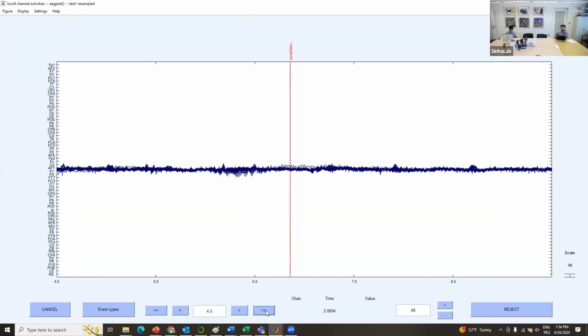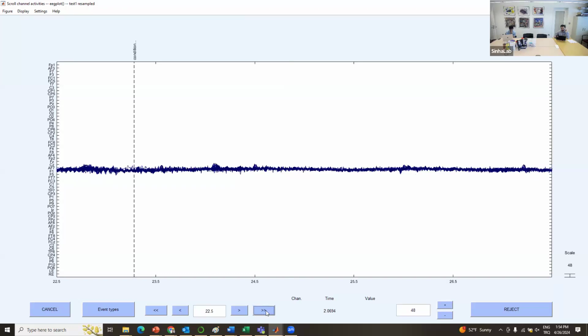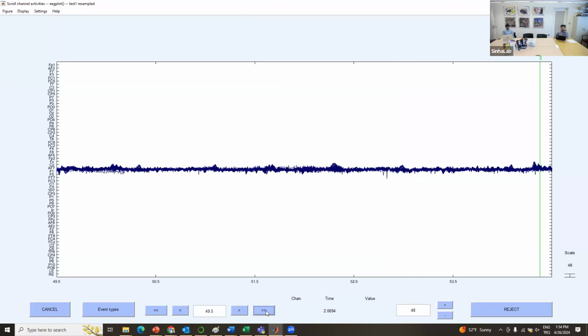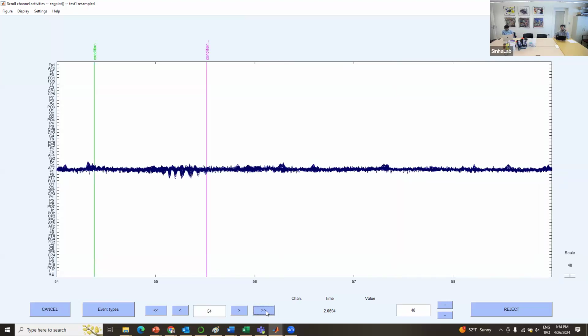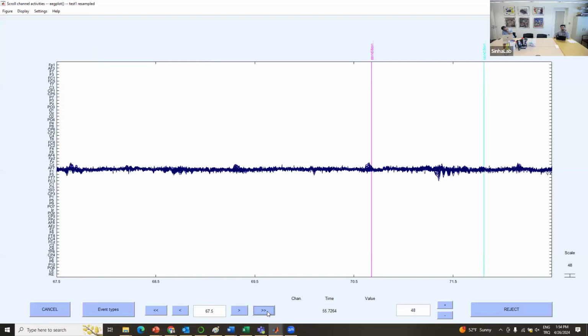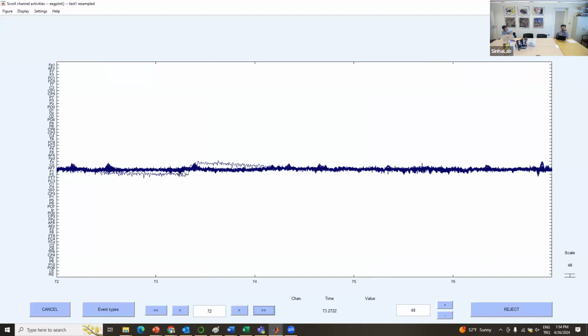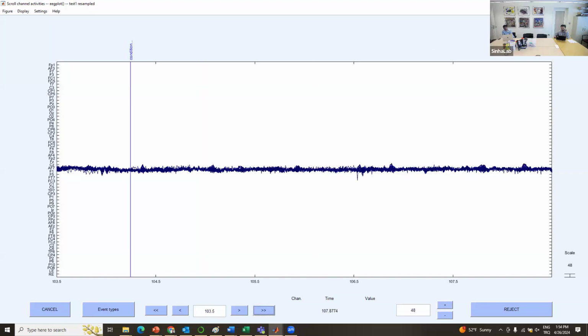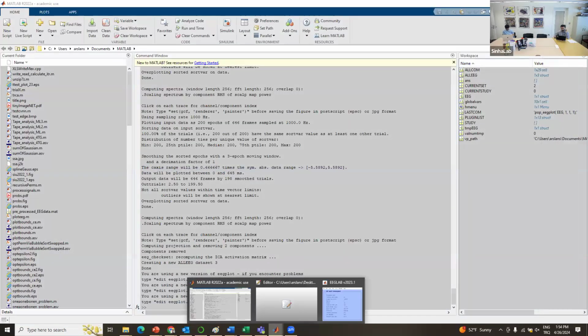And then you move to the right, and you will realize that some of the signal components show some digression, for example this one or these ones. So these digressions are indicating that there's something fishy going on in the EEG signal. And therefore, the ICA should not show these weird looking signals.